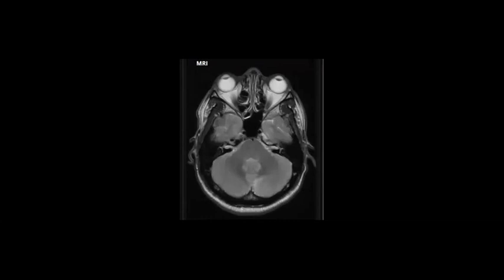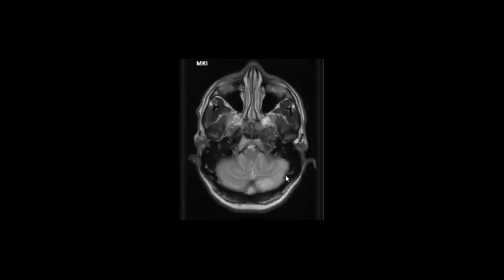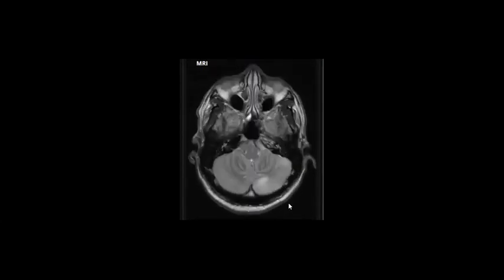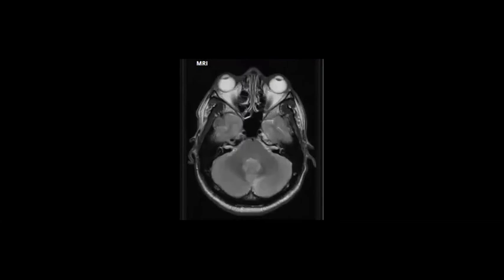When you find this appearance, what do you think about this dot? So it could be metastasis, carcinomatosis, and finally it can be inflammatory like meningitis.